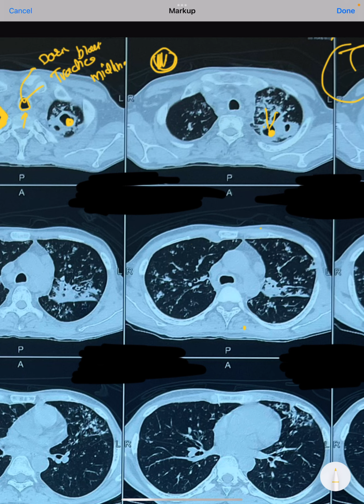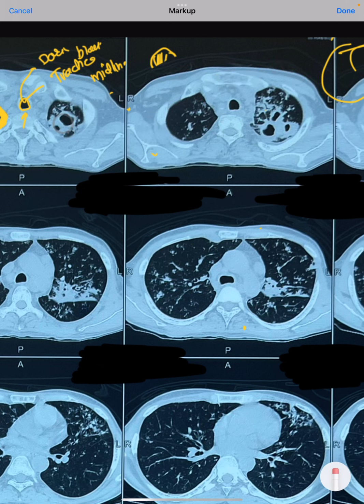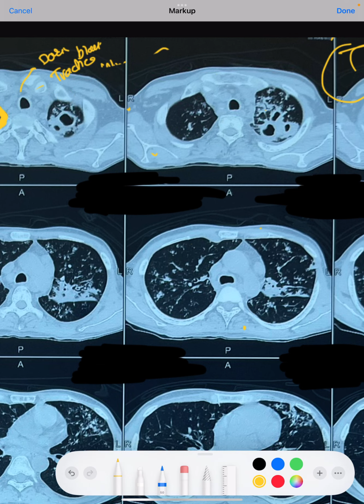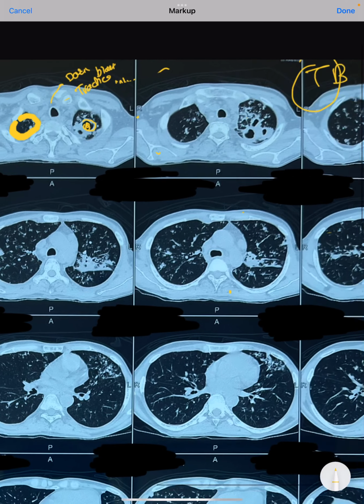The presence of this type of ball within a cavity is almost always aspergillosis, what we call a fungal ball. We must know this because such patients won't improve with antibiotics. Such patients will definitely need voriconazole. With voriconazole, the patients markedly improve if it is aspergillosis. So this CT scan is very nicely showing multiple fibrocavitary lesions. This is the cavity and this is the fibrous lesion. So this is a fibrocavitary lesion, and there are more than three.